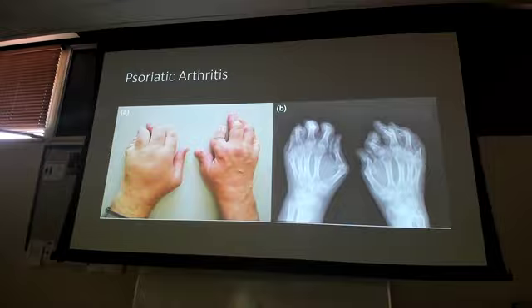These fingers are straight out. They're not ulnar deviated like the rheumatoid arthritis was, where they were shooting out to the ulnar side like this way. These ones are straight up and down, and they're more kind of crunched up, and they got those sausage fingers and toes, and they got some pencil in a cup deformities right here starting, right here the thumb, right? Right there, pencil in a cup, kind of starting over here as well. So between the pencil in a cup and the fact that there's no ulnar deviation compared to the rheumatoid arthritis.